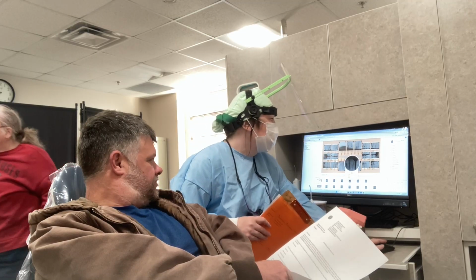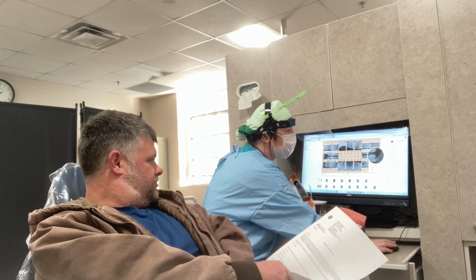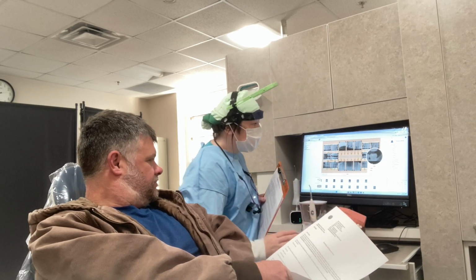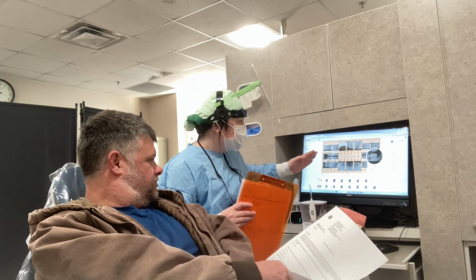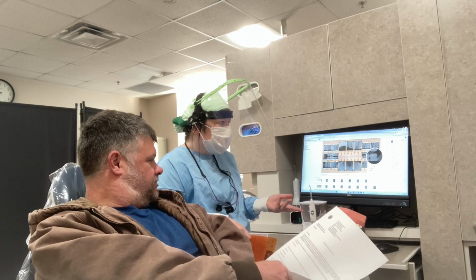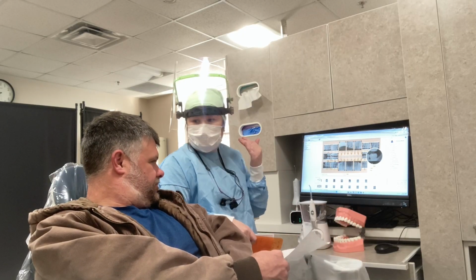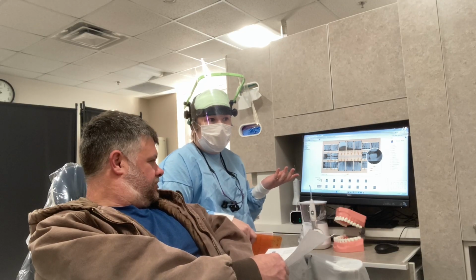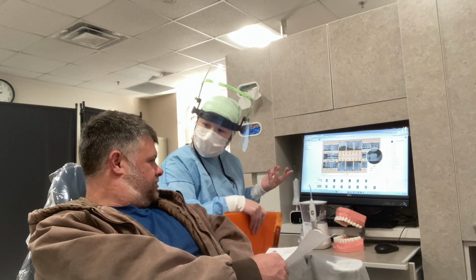Also, something I thought about was you had your wisdom teeth removed. So it's really fascinating on individuals that haven't had them removed. They're going to be right here at the end of the teeth. And sometimes, most of the time, they're not going to come in straight like these other teeth. They usually push on the teeth and go in crazy directions. And it's so important that those individuals get them out, which might have been the case for you since you had yours removed, because they can affect the alignment of all of the teeth, and also they can potentially get impacted and affected and have just general oral health issues because you don't get them out. So good for you for getting them out a long time ago.